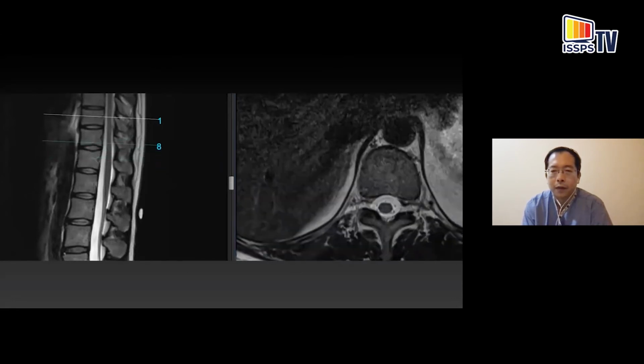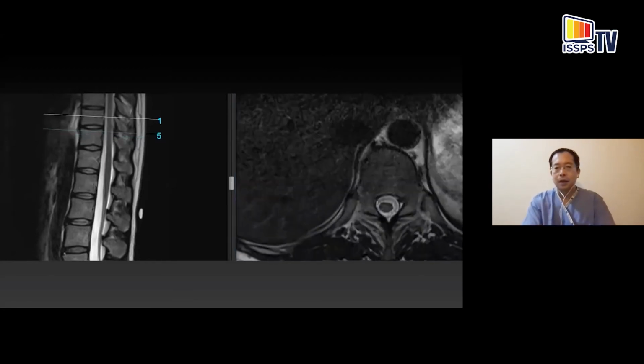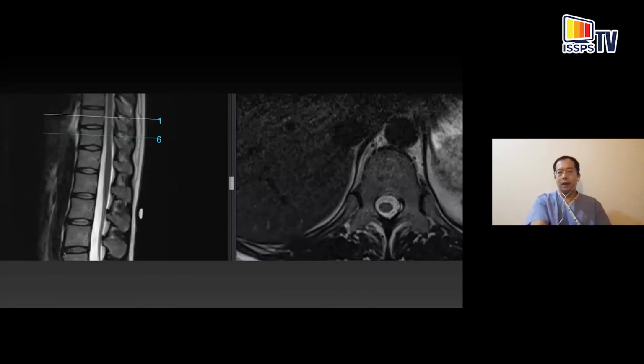Okay, so this is what Dr. Barnard was talking about. At the lower part of the thoracic spine, this is the cauda equina nerve roots, the filum terminale. So probably this is around L1 level, T12, T11, T10. Now this is where the anatomy changes drastically. From T10, you don't have a nice transverse process like you used to in the upper or the mid thoracic spine. Look at how short and beady these guys are. The costotransverse joint is almost non-existent at this level.